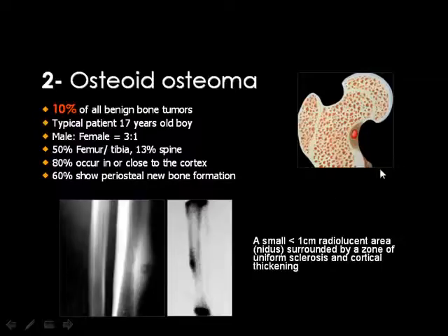The osteoid osteoma is a radiolucent lesion with a sclerotic cortex and maybe a central nidus of calcification. And if you look at this lesion, which is a classic for osteoid osteoma, you can see a radiolucent lesion. This is the whole nidus. The nidus may contain a fleck of calcium which is central in position, and this lesion will show an increased uptake by bone scan. This is one of the commonest musculoskeletal tumors. It represents about 10% of all benign tumors of the bone.